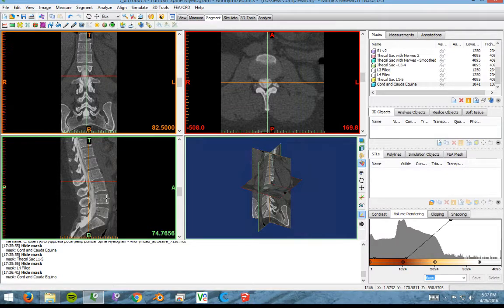This was a study that had 0.6 millimeter sections, so it was thin enough to do MPRs and create a smooth 3D model. So the first step to segmentation is called thresholding. Now we're going to use kind of a cooking show approach to this. You can see I already have a lot of stuff segmented out, and I'm going to show you how you get started segmenting, but to spare you the numerous hours of tweaking the model, we're going to skip ahead to a fully segmented model eventually.